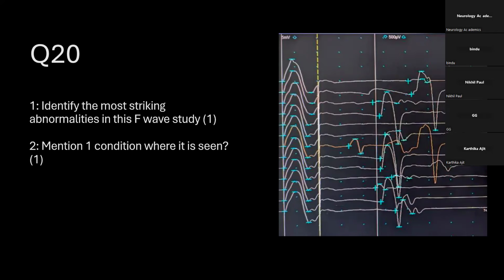So you can see that there are repetitive F-waves. Three or four of them are looking the same, and they are also giant F-waves. So if you write any of them, I think it's eligible for a correct answer.